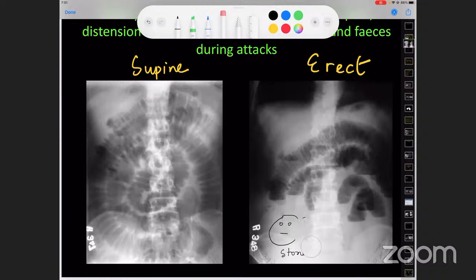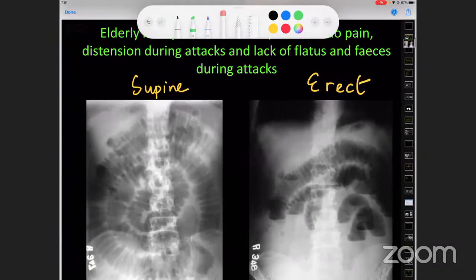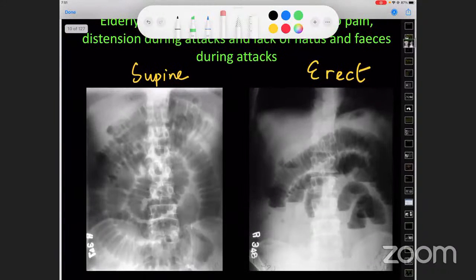No, because see, in an emergency, I will ask Dr. Bakshi now. Dr. Bakshi, sir, in this patient, this is the erect X-ray and the supine. We are not exactly talking about gallbladder diseases in this one. Sir, would you like to do a CT scan in this patient? Yes, don't forget he's 75 years old. One of the things that I would be thinking of is a malignant lesion, cancer, with the gallstone.